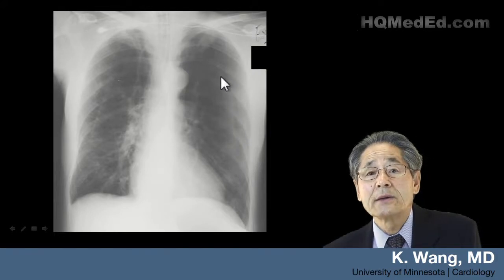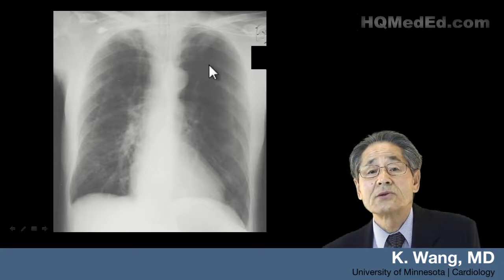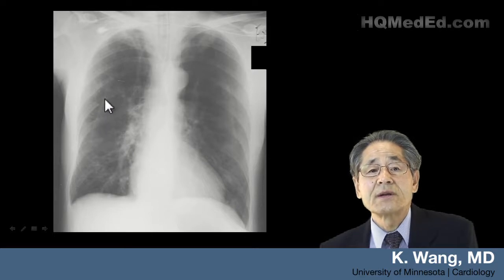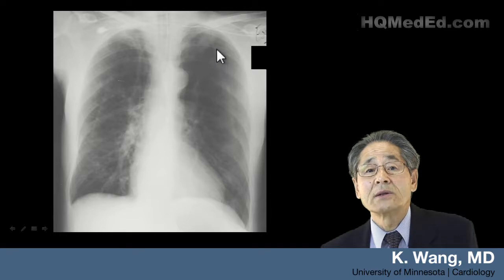There's a line here, and there's no lung markings here. Some may call this a pneumothorax. Here's a line here too. But on this side, the lung markings go beyond. What are we dealing with? This is a skin fold. This is a skin fold simulating, especially up here where there's no lung markings. Some may call this a pneumothorax, while actually it is just a skin fold.